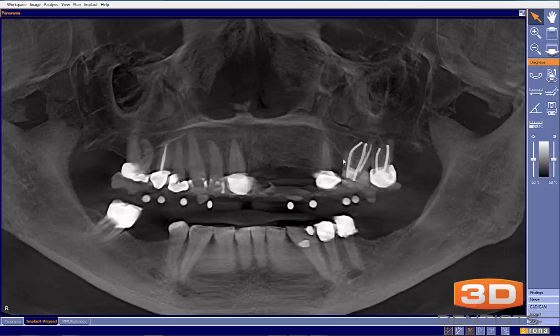Okay, we've been sent a case today to evaluate for missing teeth number 9, 10, 11, and the dentist wants to do a 3-unit bridge. So I want to start from the beginning on this one and take a look at a couple of things. One, we see our patient, and my first question is going to be what kind of guide are we going to use, analog or digital?